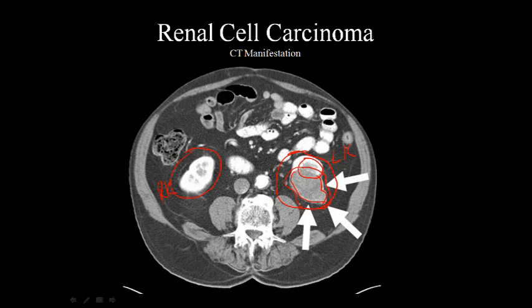Also, we see that it has encroachment of the parenchyma of the renal tissue of the left kidney. Also, to some degree, it looks like it has made some degree of enhancement, which would be slightly distinguishable around 10 to 25 Hounsfield units. We'd have to take measurements of this area before and after the scan to actually see. But I would say that it contrasts slightly.